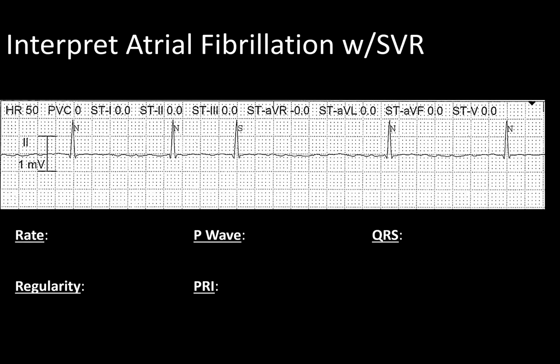So this is typically what we see with AFib. This is an actual patient and what you would see. We can see immediately that it is irregular and that it's slow. And of course this is a 6-second strip. There's really no pattern. And there's no ectopics. So my rate, 1, 2, 3, 4, and 5. 5 times 10 equals 50. And so we're bradycardic. So we know we're slow.